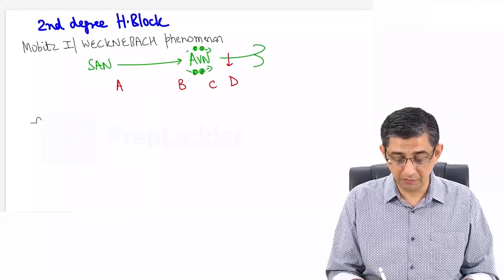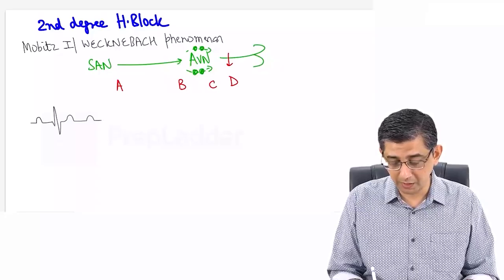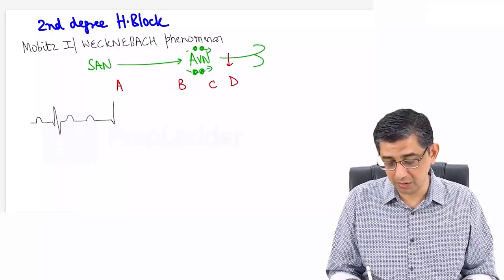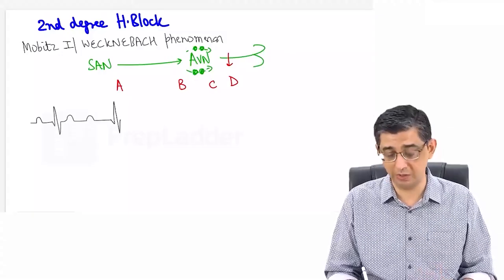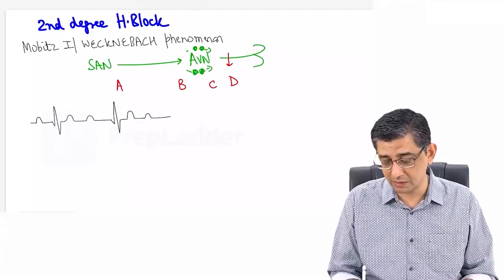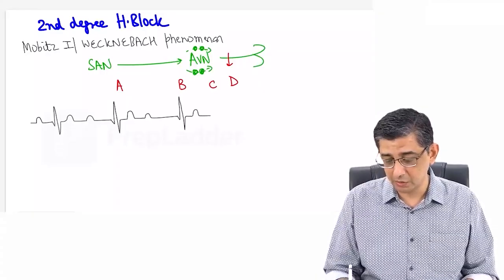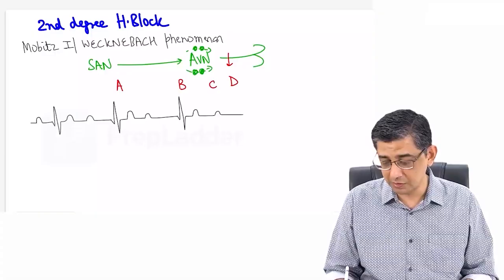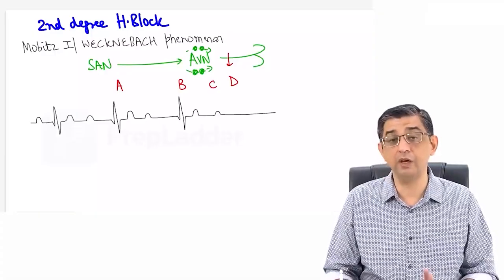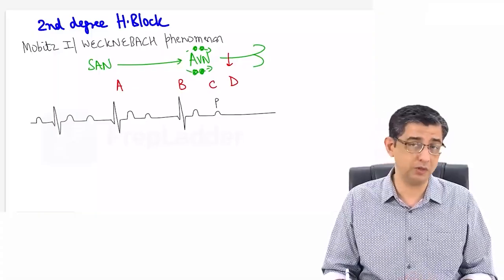When you scan the ECG from left to right, you will notice a progressive increase in the PR interval of this patient. Please be patient while I just hand draw the same before you, because the easiest for me is to show you an ECG, but then the point is lots of times you might miss a couple of facts. So let's just try to hand draw this so that we can get a better orientation. You see, whenever you see the ECG of this person, you will always see an area where after the P wave, you will notice there is no QRS complex.